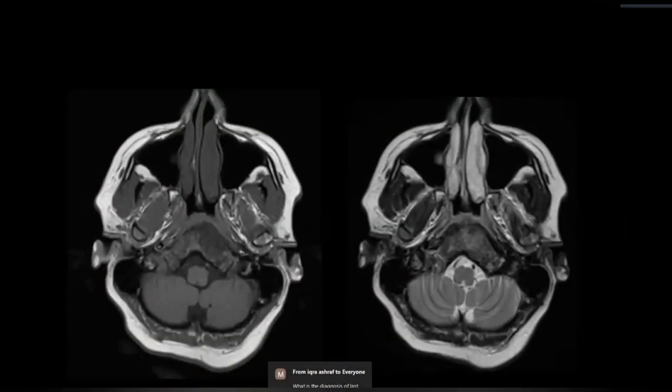Sir, these are the multiple sections, slices of MRI, T1 and T2 images, axial sections at the level of maxillary sinuses, in which I can see an abnormal MR signal intensity area evident in the petroclival area, which is hypo on T1 and subtle showing hyper intensity on T2, and it is expansile involving the petrous part of the temporal bone.